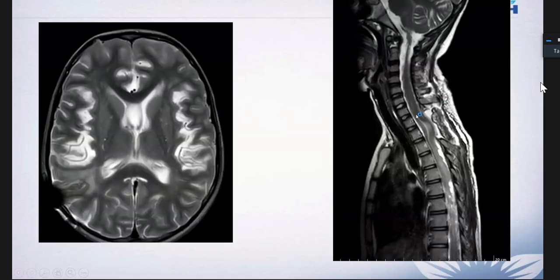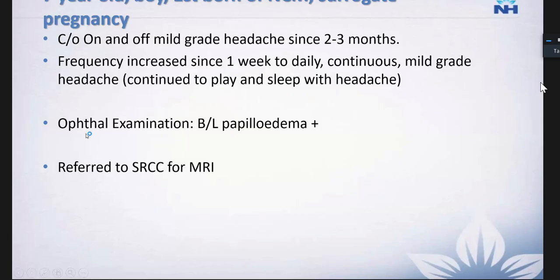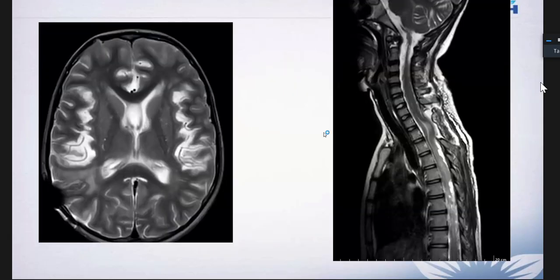So these are the post-op images, which show the area from which the biopsy was taken, and subsequently you can also see the disproportionate widening of the cerebral sulcal spaces surrounding the opercular regions of the bilateral cerebral hemispheres. Right. So that was an atypical case that we came across recently.